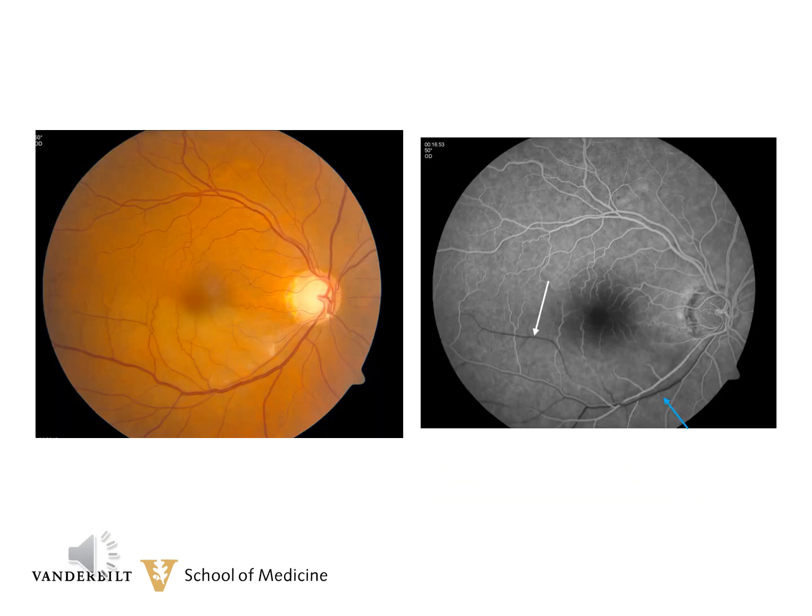This patient has suffered an inferior branch artery occlusion. The inner retina is creamy colored from the intraretinal edema. There's one faint cottonwool spot along the inferior arcade. The white arrow on the angiogram points out the lack of filling of the more distal arteriole.